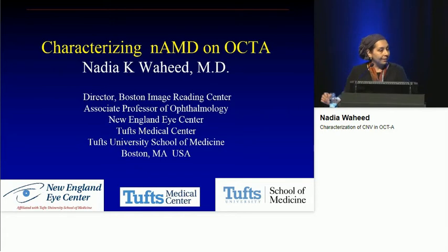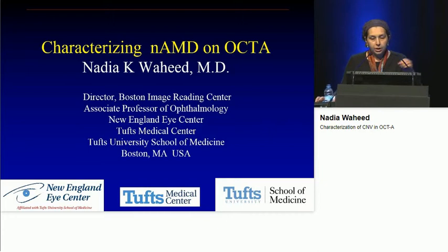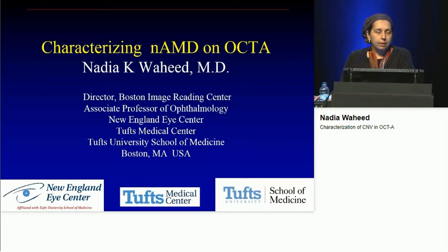Thank you so much. So I'm going to be speaking on characterizing neovascular AMD on OCT angiography, and basically just looking at some of the heterogeneous features that we use in evaluating CNV both clinically as well as for clinical trials.